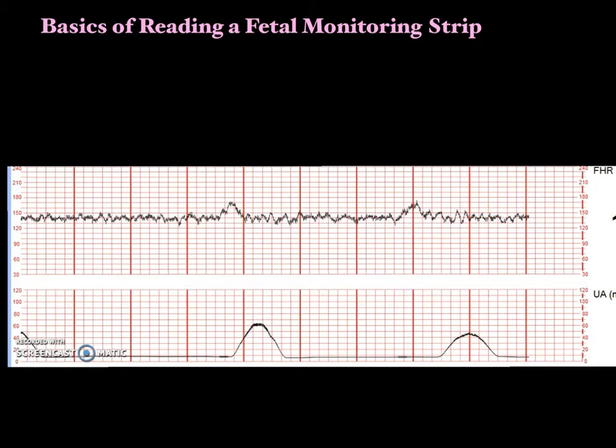Okay, well, I'm glad we got rid of that strip. It was pretty ugly. Now we're going back to a nice normal strip. And if you remember what I told you in antepartum, this is what we would look for as a reactive non-stress test. Now, it's very reassuring. We have these accelerations of the fetal heart rate. Accelerations are one of the changes from baseline. And they are indicative of fetal well-being.